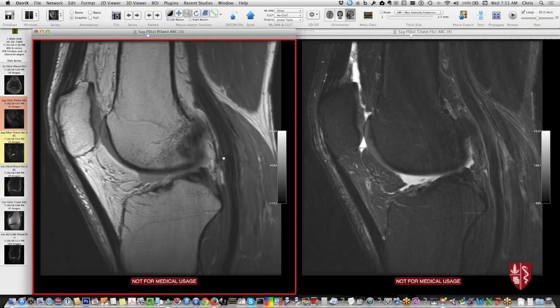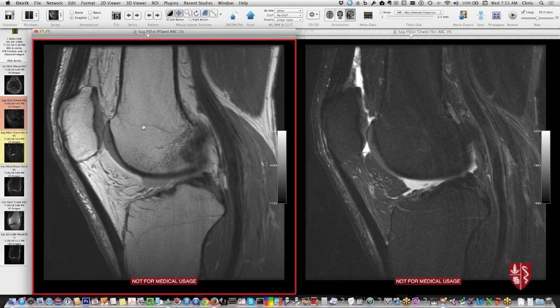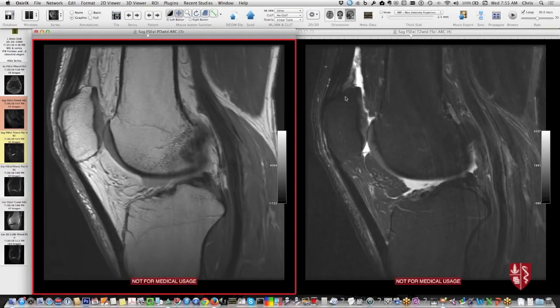So the sagittal images sweep through, recheck the medial and lateral compartments, and then the cruciates, and then we're good to go, and we think, well, what have we not seen? And really the thing that we haven't seen is the extensor compartment and the patellofemoral compartment. So you've got the quadriceps tendon, patella, patellar tendon, looking at the thickness and signal intensity in those on both sequences.